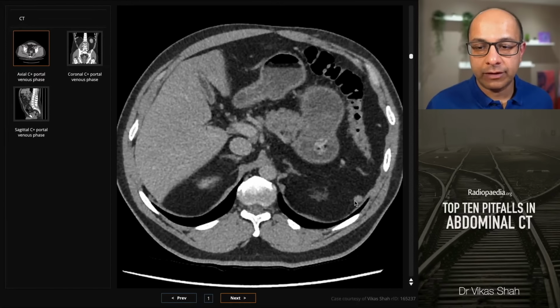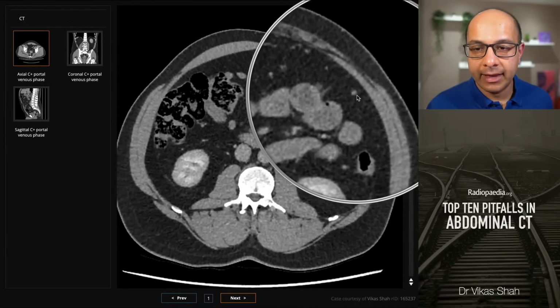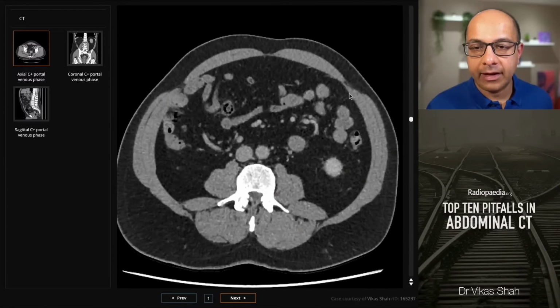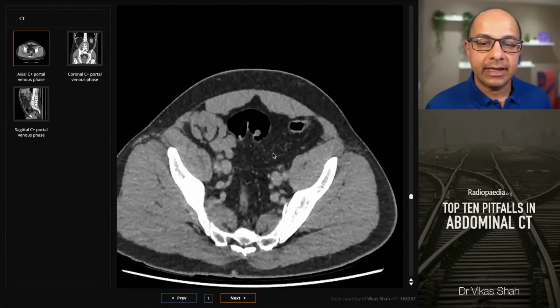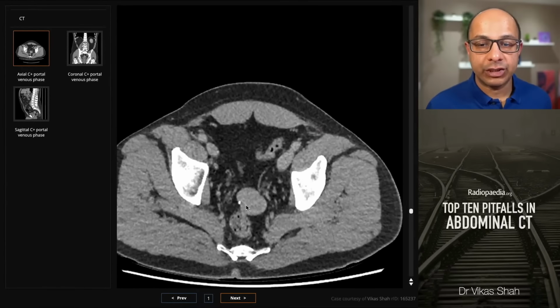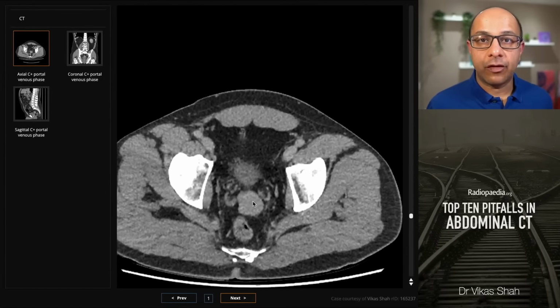So here is a small nodule of tissue. As we scroll down this patient's abdomen, then we see that deep to the abdominal wall there's another small nodule there. Further here, another small nodule, and the largest bit of tissue is here in the pelvis, anterior to the rectum and just superior to the seminal vesicles. So their blood supply will be from other arteries.